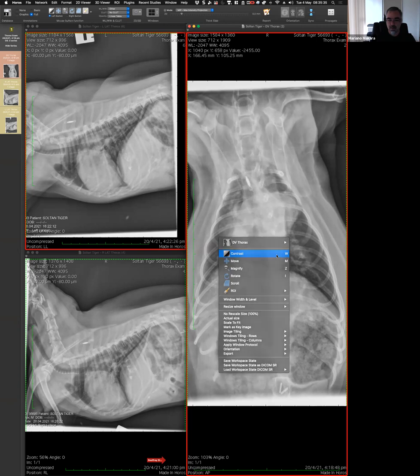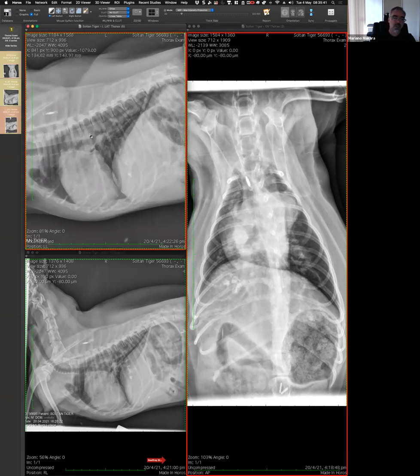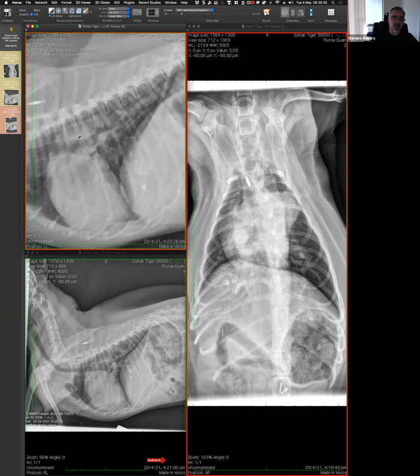But let me see if I window. So that, I think, is a tortuous pulmonary artery. And I don't know if you see here, but if you have a way to tell your brain, take a photo now, do that, because this is how the very enlarged and tortuous pulmonary arteries look like, superimposed over the trachea. See that? I don't know if you see that here. There is kind of an undulating contour here, like something going wavy, boom, boom, boom, boom. So that's a tortuous pulmonary artery.